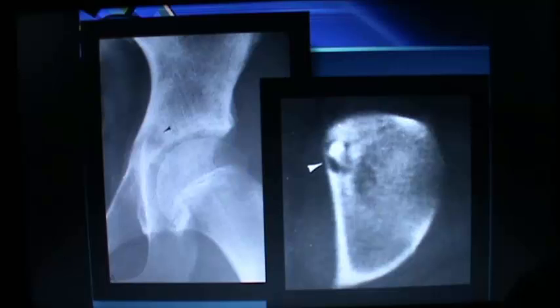And these are different images within the CT, where the same appears. Now, we agree about the nidus, vascular, osteoid, but what about the central calcific part within? This means that the central part is now quiescent and the peripheral part is the aggressive one, doing the work, and the central quiescent part becomes calcific. Here, central calcific, then the active nidus, and then the periosteal reaction around.